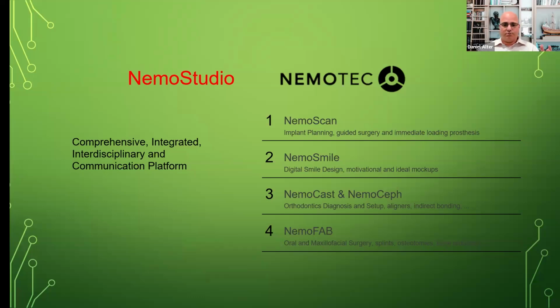So when you get into this software package, which has an application on your PC, it's incredibly robust, and when I start designing in a little bit, you'll see the functionality and the ability to incorporate in a tremendous way a lot of data sets, which are incredibly important, because the data sets, as well as the face scans, as well as the DICOM file, and so on and so forth, allow us to do some sophisticated implant planning and surgical guides.